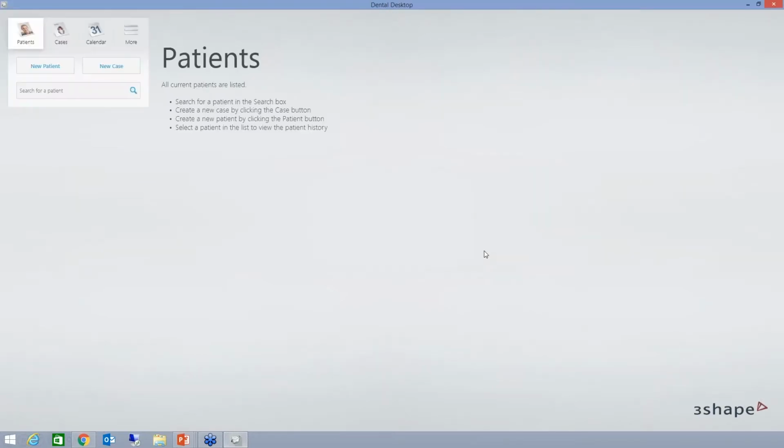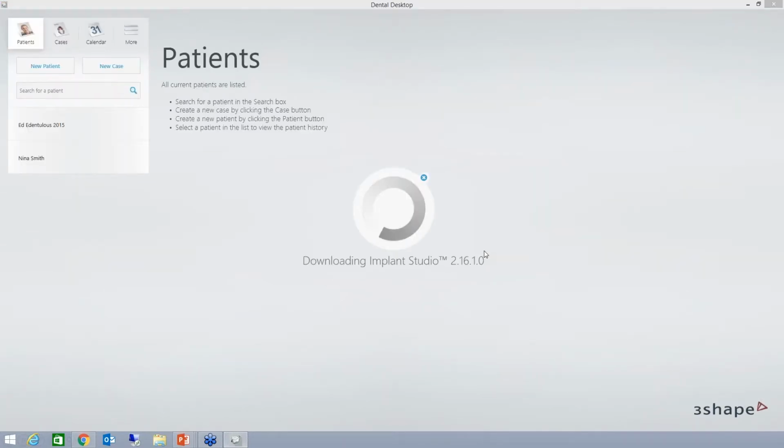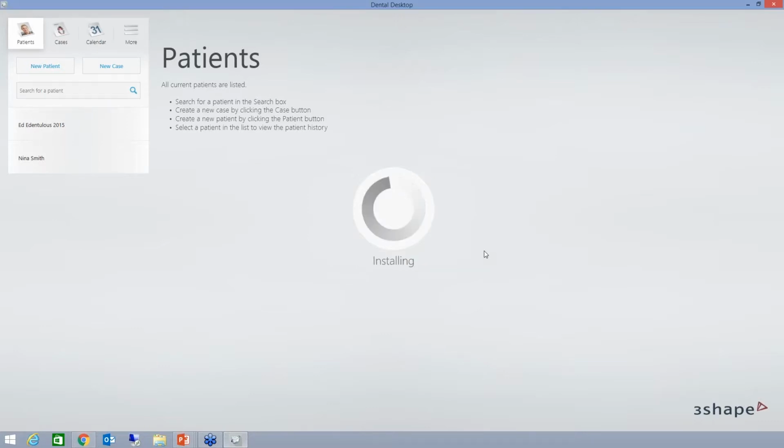Yeah, so I will gladly also show that and explain that. If you have 2014 version and you would like to upgrade to 16, it won't be possible to upgrade from within the 14 version, at least for now. But you can easily download the installer and install it as a new user, the version 2016. And both versions, 14 and 16, can coexist on the same computer, so you will have both of them. Yeah, but I will continue this topic just in a minute or two.